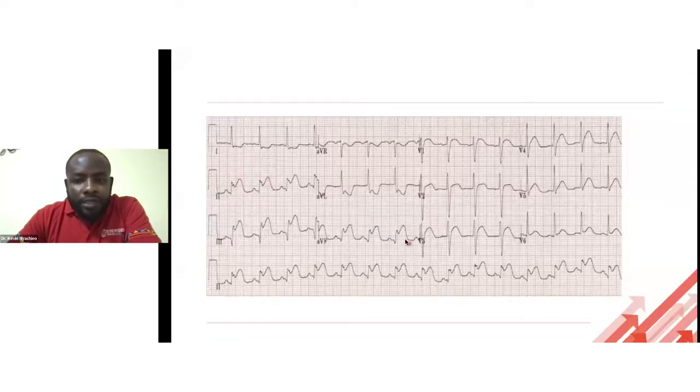From the diagram again, remember, inferior myocardial infarctions are usually a lesion of the right coronary artery. And sometimes the right coronary artery gives off a branch to the AV nodal artery, so the branch supplying the AV node is knocked off.